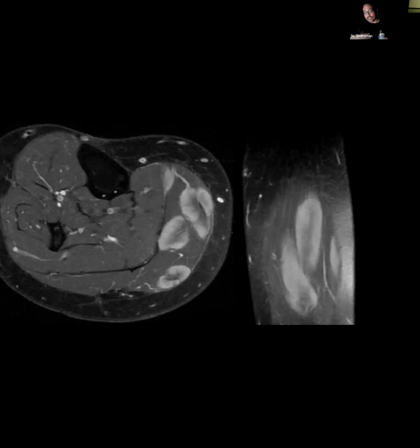When we do see it, unfortunately, when sarcoid involves the MSK, musculoskeletal system, this portends a poor prognosis, okay? Loves to involve the myotendinous junction. In the axial plane, you'll see this sort of spiculated appearance, giving what's called the dark star sign. And then if you image it in the longitudinal axis, you'll see the stripe sign, or what's been called the three stripe sign, 1, 2, 3. So this is a nice, proven case of sarcoidosis.